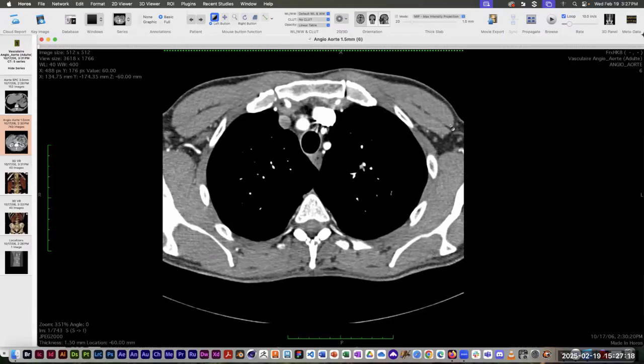So it would probably work reasonably well on a bone, maybe, especially if that bone was completely separated from other bones. I think if I tried to use this on the vertebrae, it would select all of the vertebrae together and give me the whole vertebral column because they touch, they overlap.